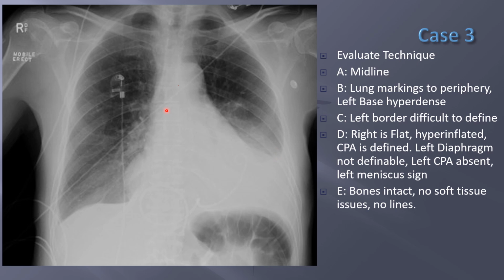And C, cardiac silhouette. It's probably a little large. It might be normal, but there's fluid here, so it might be making this heart border appear really large. It only comes out a little bit on the right side. If you recall from the previous image with the cardiomegaly, it really came out. So if this only comes out a little bit, maybe you might have a more normal cardiac silhouette, but it's hard to tell with this pleural effusion here. So that's our cardiac, C.